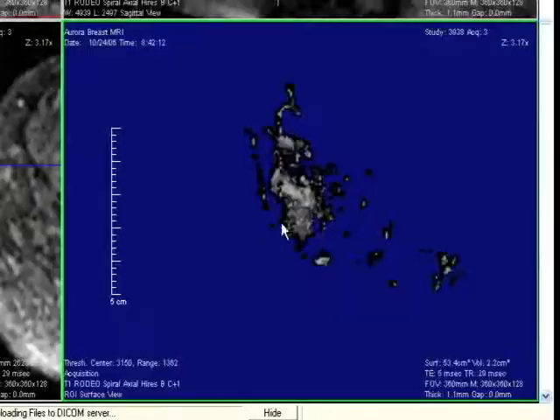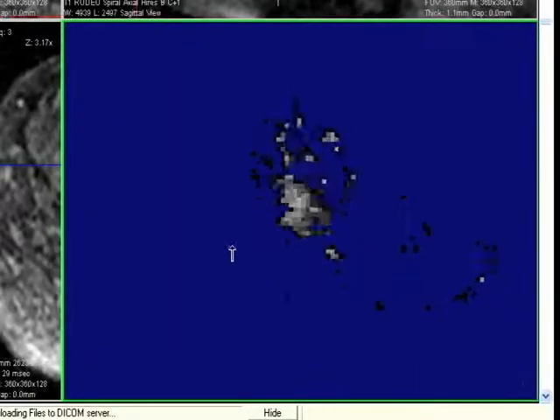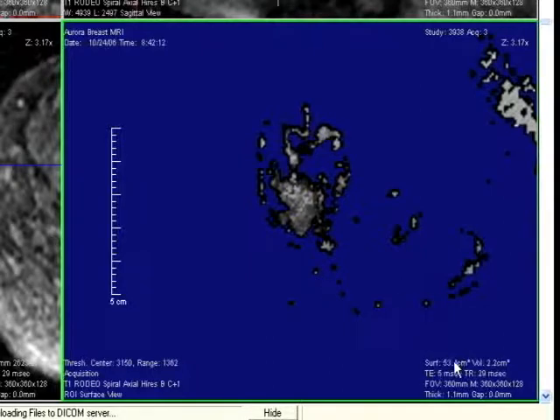We can rotate our volume to check the size. The tumor volume and surface area numbers are seen in the lower right of the frame. Clearly, this is a partial response.